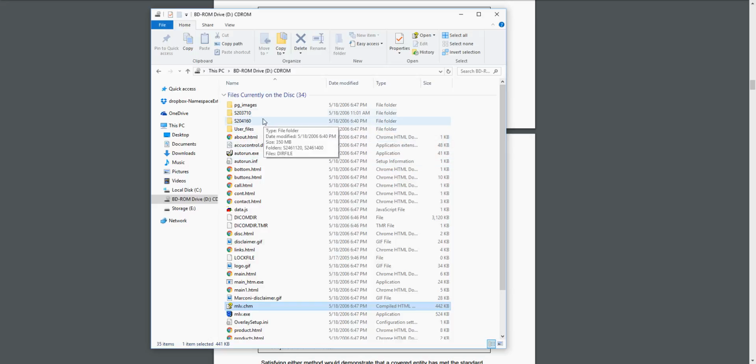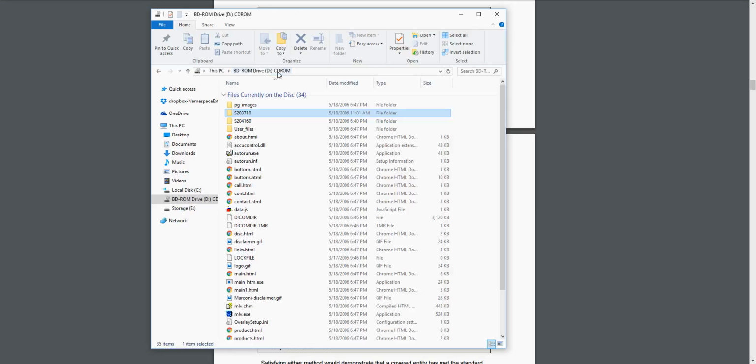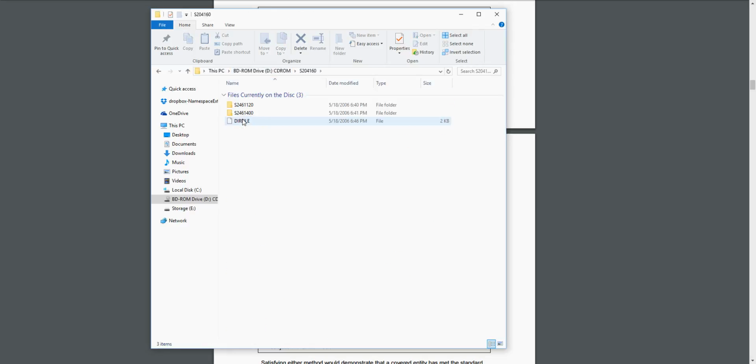But what I am interested in is what's in these folders. So this CD, for some reason, had a scan of an 80-year-old male's head. It had nothing to do with my feet. I think it was just some mistake by the technician. But this has 2 folders, and these are 2 different scans of my feet.